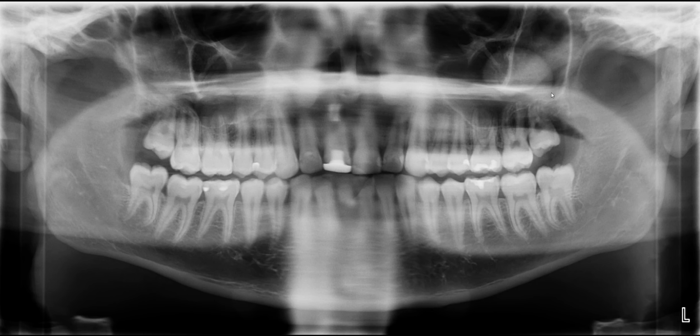So let's figure out what this opacity may be. Before doing that, let's identify some structures in the maxillary sinus. A very dense opaque line that is horizontally extending in this direction represents the hard palate. Over here represents the medial wall of the maxillary sinus, and here we have the floor of the maxillary sinus. And starting here, what we're seeing is the posterior wall of the maxillary sinus. So here we have the posterior wall and the floor of the sinus.